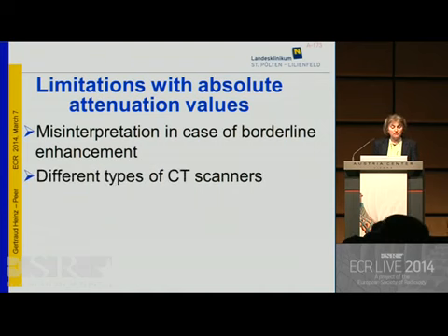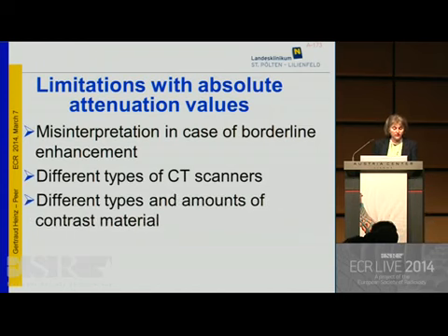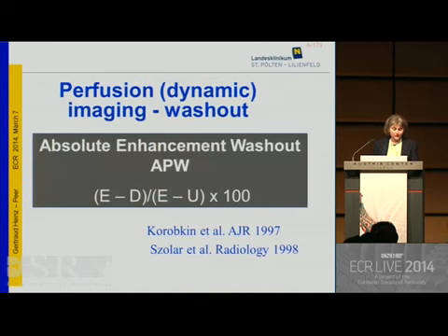These absolute values are also dependent on the different types of CT scanners, on patient factors, on the contrast material use, and even dependent on different delivery rates. So it has been proven that calculating the washout is much more precise and more sensitive and specific.